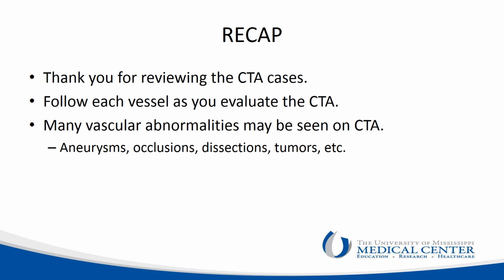As a recap, thank you for reviewing the CTA cases. Remember to follow each artery as you evaluate the CTA, and remember that many vascular abnormalities can be seen: aneurysms, occlusions, dissections, tumors, and others.